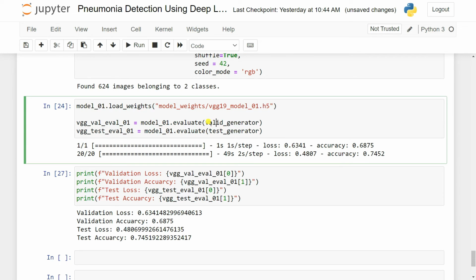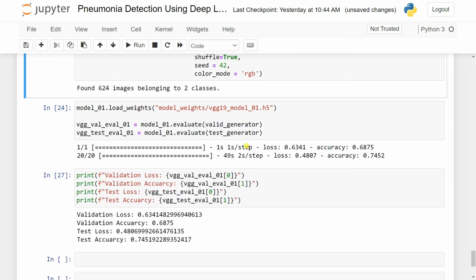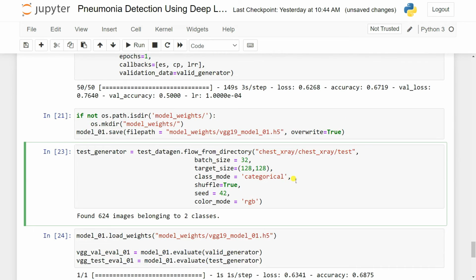So now what I can do is simply fine tune it. You can also do the confusion matrix, and you can also draw this out. Don't worry, I will give you the complete clean code for that, but I will upload it maybe 3 or 4 days later, because I need to implement this one also, right?